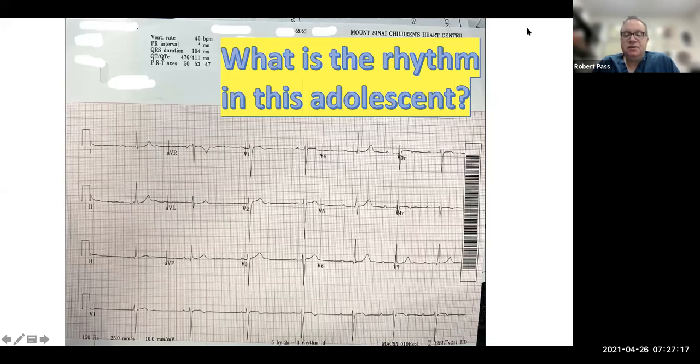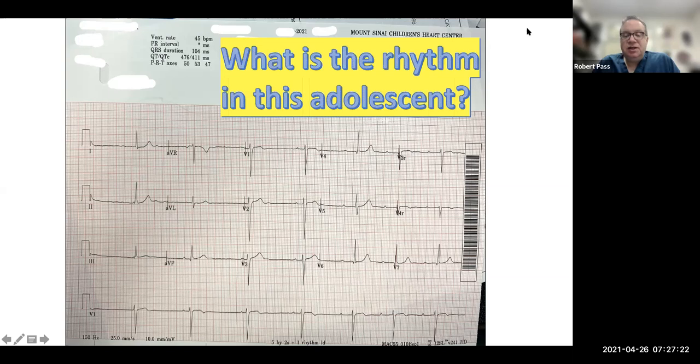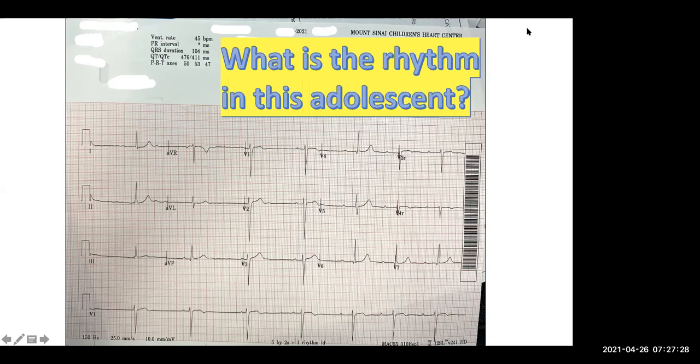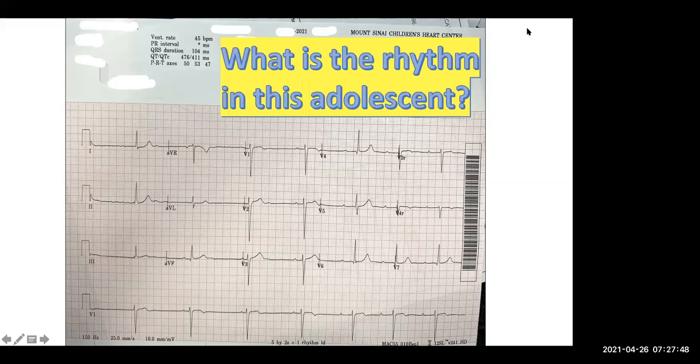Yeah, that's very good, Grace. Excellent. And at the right-hand side, we see a fairly consistent PR interval, right? Mm-hmm. And so how would you describe this now? So now you've sort of got it all. If someone's in the emergency room, you're seeing this patient, you're calling me at night, I don't have a fax machine or a cell phone, how would you describe this rhythm to me?